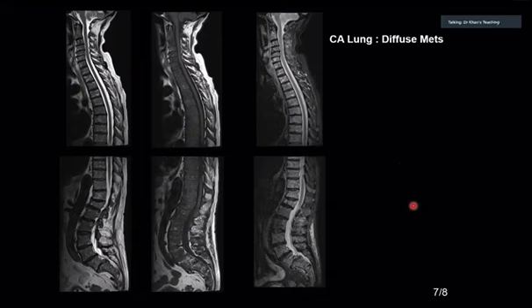And in this case, we can see the same thing. If you start looking at it carefully, look at this vertebra, and you will appreciate that it is higher in signal than the intervertebral disc. And then look at the stir. So this is an exam case, and it has come in the exam. So develop your eyes on this.